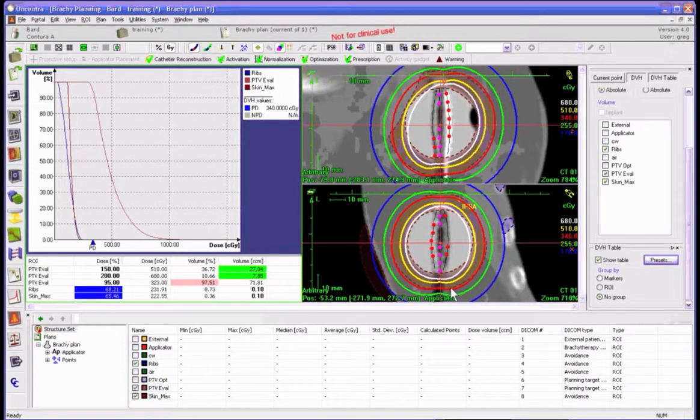The other thing we want to see here is the red isodose line here, which is our 100%. We want that to be covering our volume just very conformally. And you can see we've done a fairly decent job there and here. Of course, in the area of the chest wall where we might be willing for it to go a little bit lower, it's a little high, but that's fairly typical. We only have so much modulation to play with there.